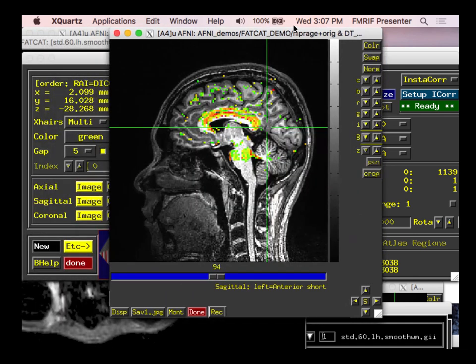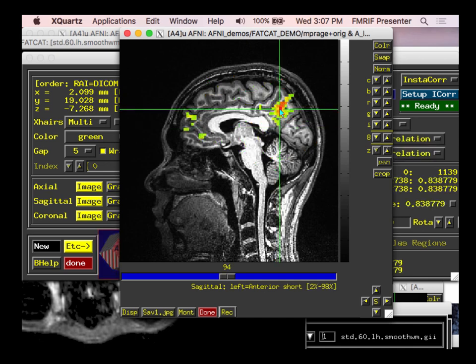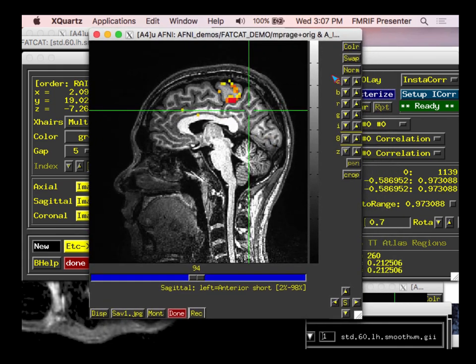And this is something that Bob set up. So what we might be interested in is I have my data, and I say I have this region here, and I want to see what is it functionally connected to elsewhere. Now let's see, there's a little bit of lag at the moment. It was catching up where I was clicking.